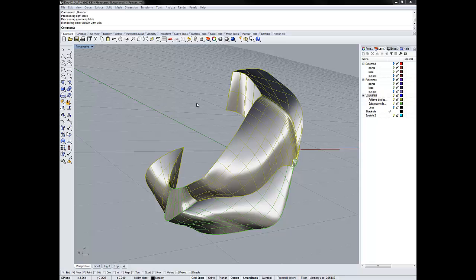From a top-level perspective, there are three things we're going to do in this tutorial. The first is we're going to take the points that correspond to exact positions of the canine diaphragm, and we're going to convert them into lines that follow the surface of the diaphragm. The second thing we're going to do is convert these lines into a surface that approximates the diaphragm of the canine. The third thing that we're going to do is create volumes between the reference and the experimental or deformed state that will provide quantitative results of the amount of positive or negative volume displacement of the diaphragm during a breathing maneuver.